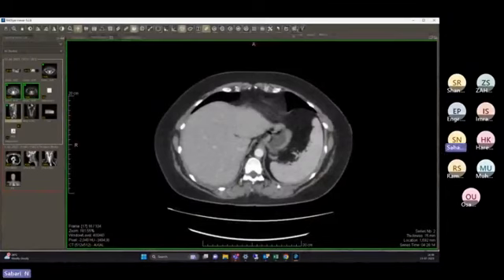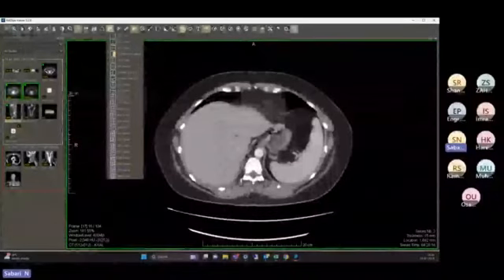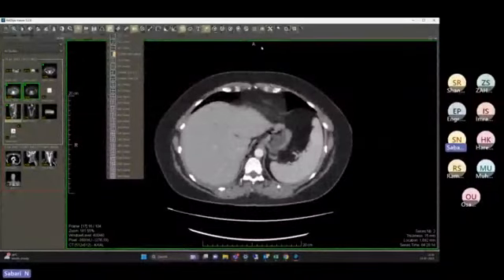And this is a hanging protocol, like capture hanging, nothing but the layout. You can select a multiple layout and click on save. By default, it will open in two windows or three windows, like that. You can set it up.